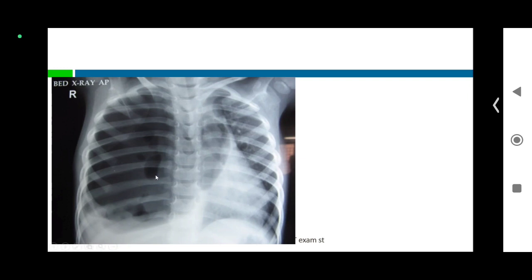See, this is not congenital lobar emphysema. You don't see any bronchovascular marking. In between, you see some fluid, air-filled pockets. You are able to see the mediastinal shift. This is a pneumothorax. You are able to see the angle filled. The fluid density you are able to see, but not jet black like outside the X-ray.